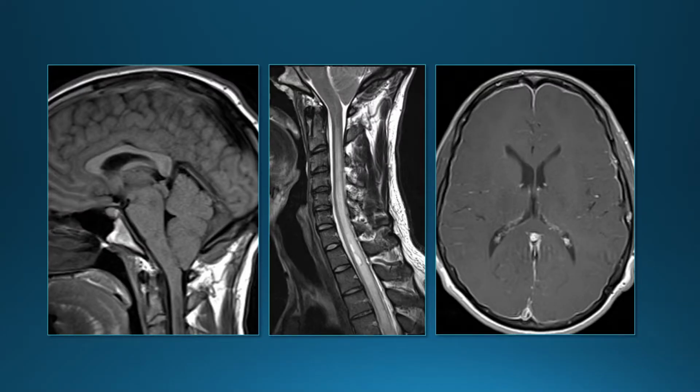One thing that you don't want to confuse a Chiari 1 malformation with is this situation. Here it looks like there's a Chiari 1. The cerebellar tonsils are down below foramen magnum. Things are tight. There's syrinx and edema within the spinal cord. But this patient has diffuse dural enhancement here. So diffuse dural or pachymeningeal enhancement. This is a patient with CSF leak and intracranial hypotension.